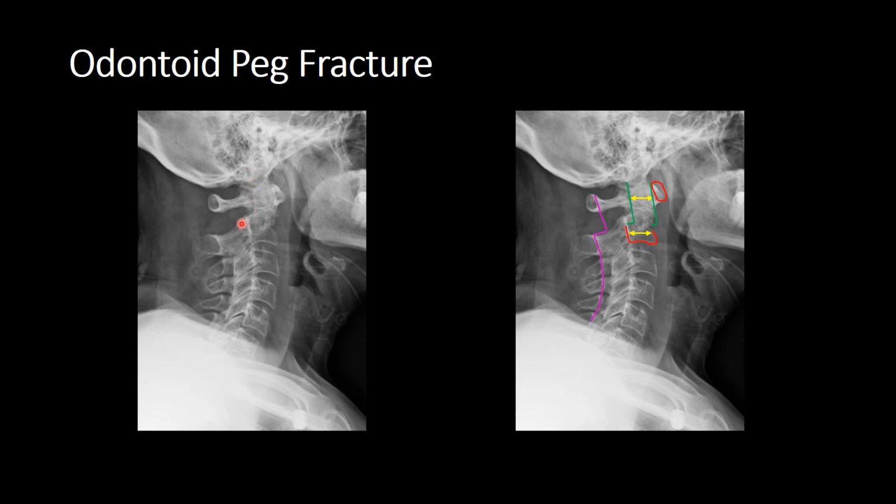So we've got an abnormality in the posterior vertebral line. So we've got 2 steps. We've got an abnormal anterior line. We've got an abnormal posterior line. Let's go down the spinolaminar line. Yep, abnormal. We've got a step. So we have malalignment in 1, 2, 3 views.